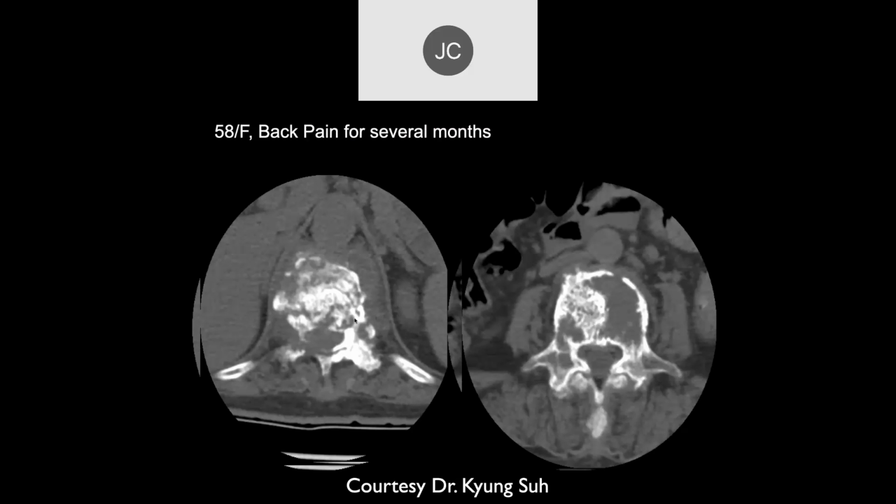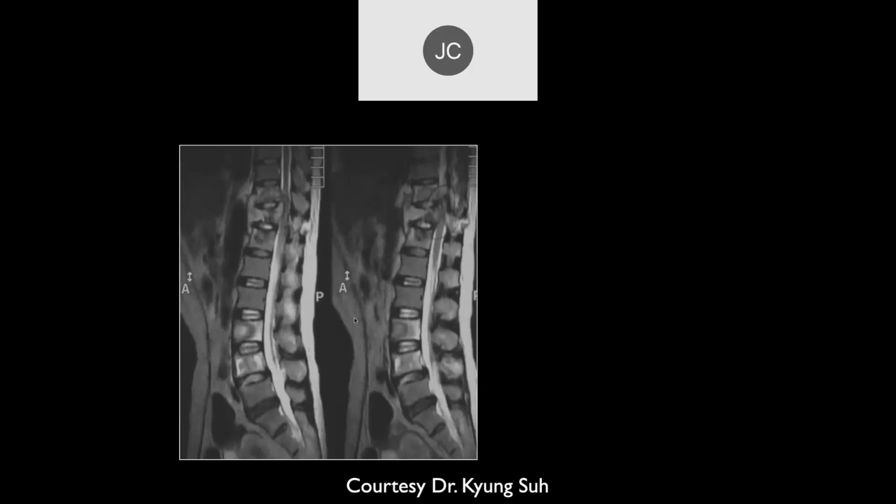We're probably going into a different level there. We go to... there's the MR scan. Okay, so it looks like lower thoracic spine, and then we have a skip down to the L3 and L4 vertebral bodies. Have some increased signal in there too. Yeah, it looks like there's some sort of epidural soft tissue that has mass effect on the spinal cord.